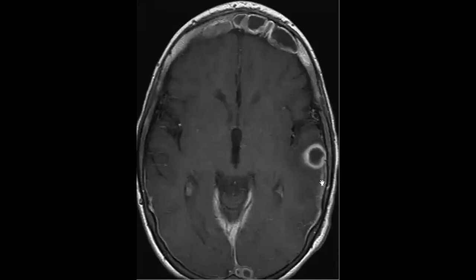And it is important to have a look at this. So what is this? Already you mentioned something related. So it is meningeal enhancement. Perfect. So when you find meningeal enhancement and a ring enhancing lesion, I think it is nice that you are going that it is now more on the inflammatory side, right? Okay. And with this dural inflammation and this abscess. So abscess with the meningeal enhancement, and there is much affection. Yeah. Okay.